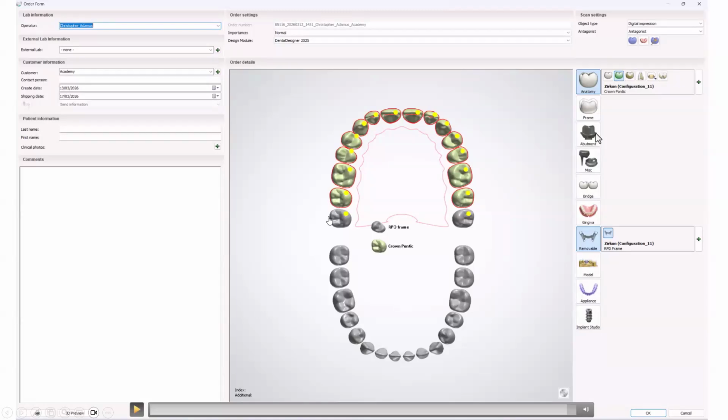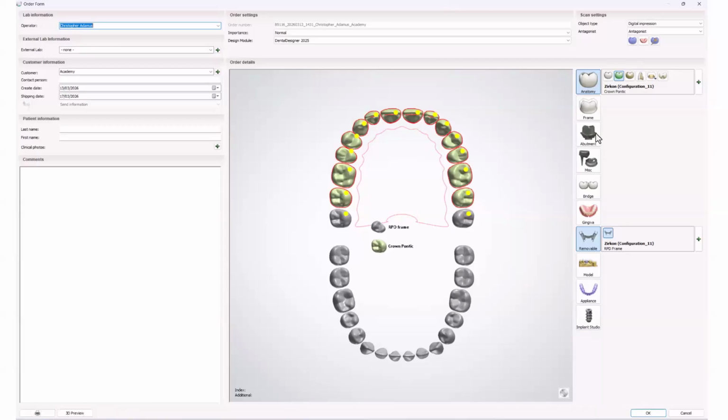Pontics can be added as an option for RPDs. So that's another option that can be done. Pontics are quite easy scalable, so we could also scale them down if there will be a necessity to finish the secondary structure, either with ceramic, if someone dares to do it, but more likely composite.